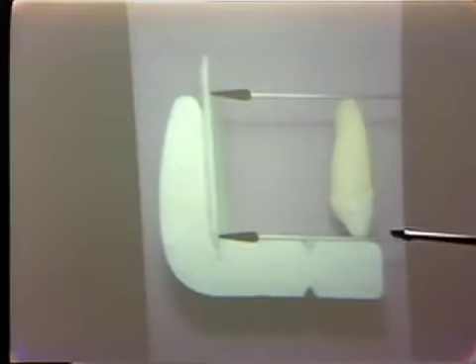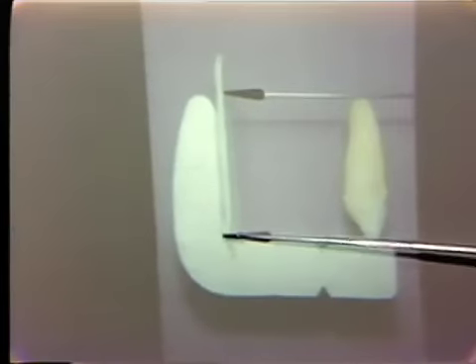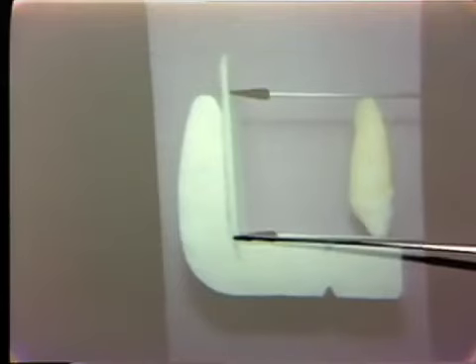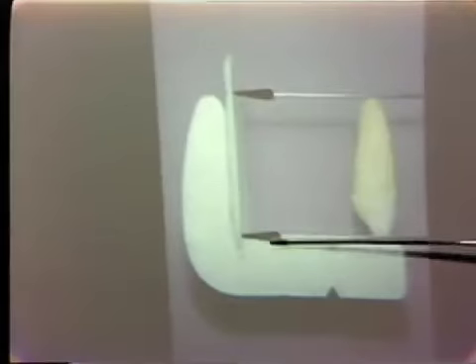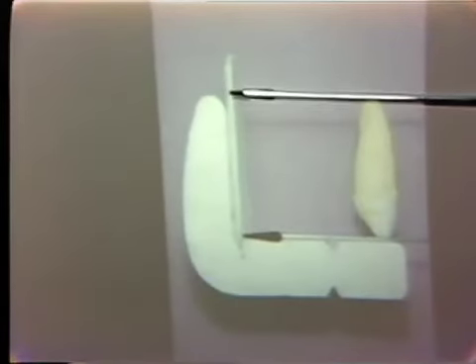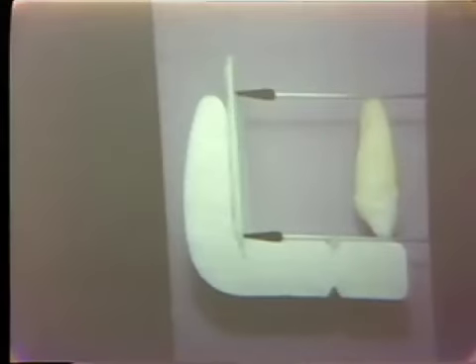We're directing the rays parallel to the top of the block, and so the incisal edge of the film records where I'm indicating, and the amount of film inserted in this groove will turn out to be black border. The apex of the tooth records at this level, and then regions superior to that also can record on the film.